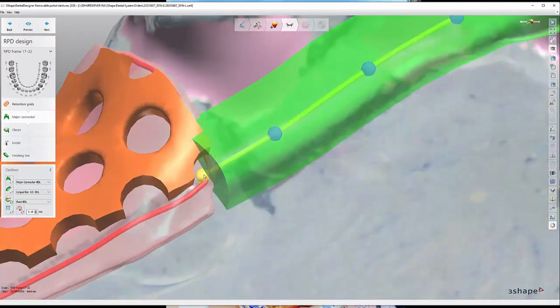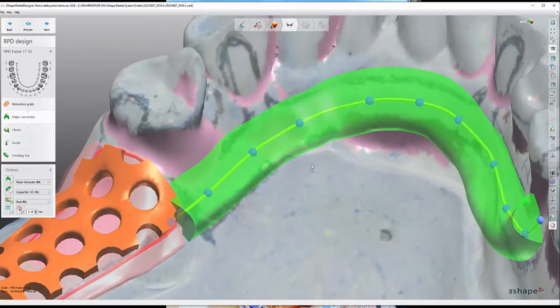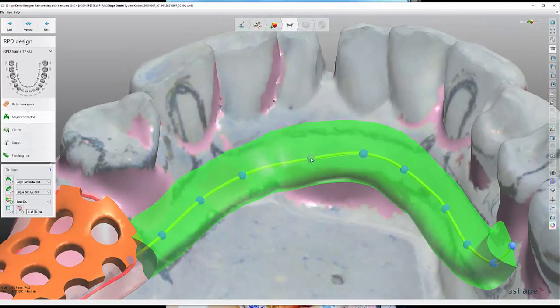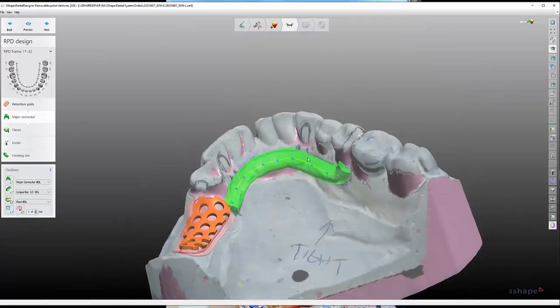So we actually are trying to have a little bit, I'll say a step right here where the mesh ends and then the lingual bar has a little, I'll say 90-degree step down. And we're looking at the drawing on our bars at the top, I'll say the very top edge of the drawing, and placing the top edge of the bar.